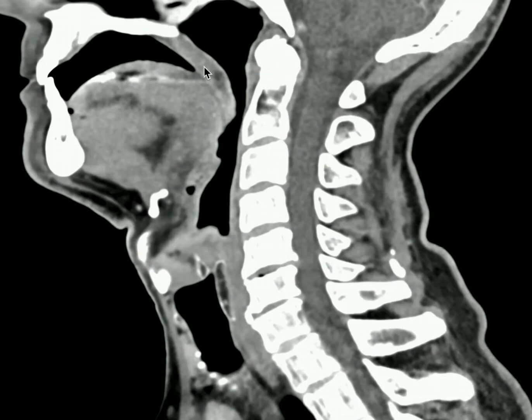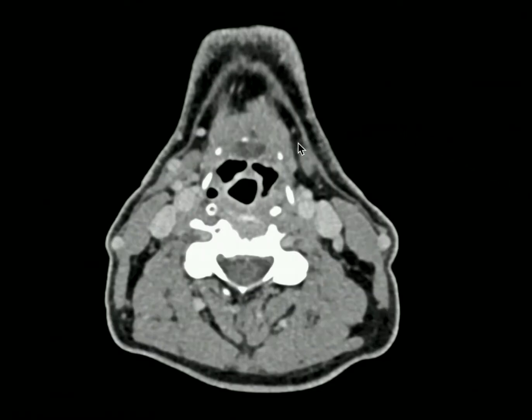The superior boundary will be formed by the roof of the soft palate, separating it from the nasopharynx above. Inferiorly, it is bounded by the median and lateral glossoepiglottic folds, which I'd like to show you on an axial CT. Here on our axial CT, we see the median glossoepiglottic fold right here. It extends from the base of the tongue to the anterior surface of the epiglottis.